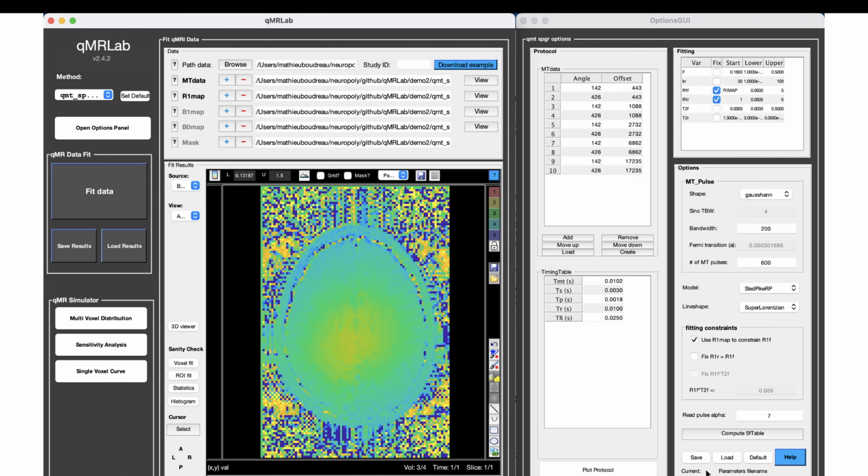And then, because it's still very noisy in the background, the mask doesn't remove the noise in this step. It'll remove it when it's doing the fit. You can change the lower and upper bound so that you're within just the human range. So here I've selected 0.7 to 1.2, and you can see our B1 map.